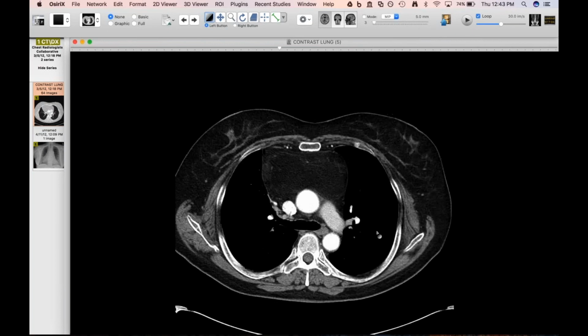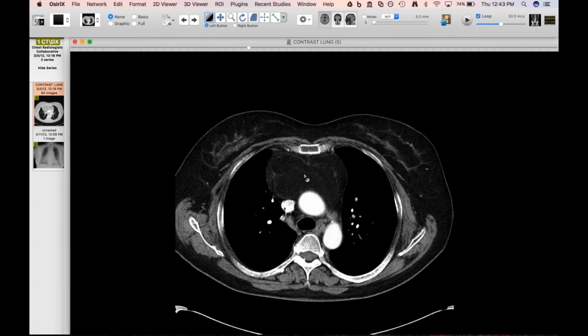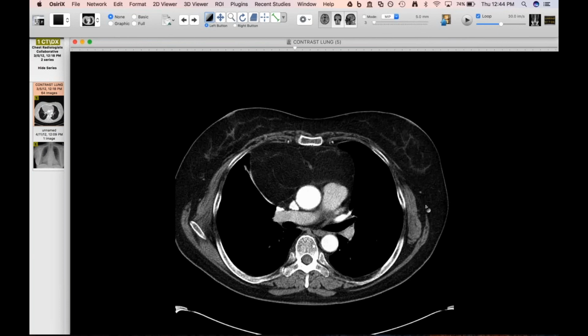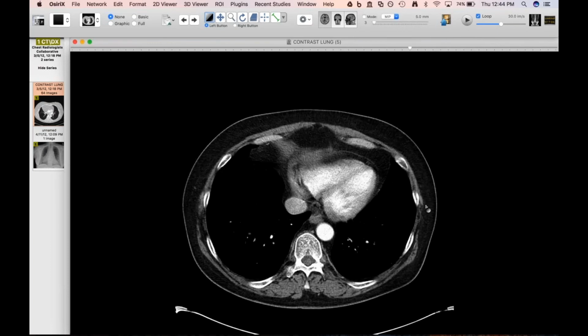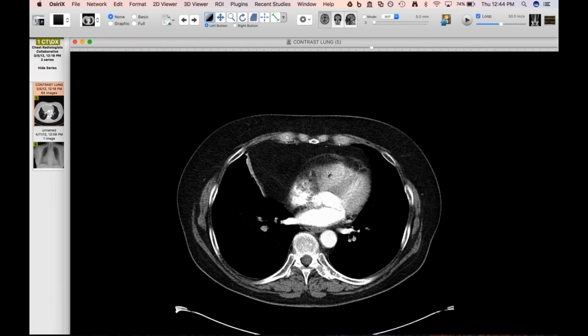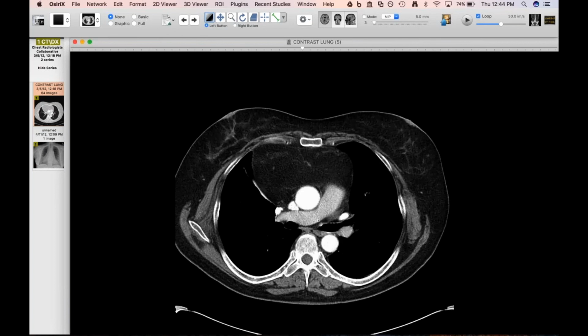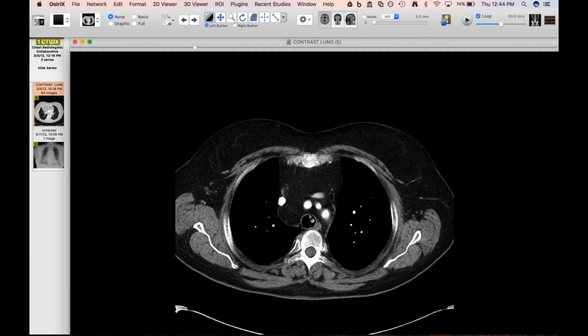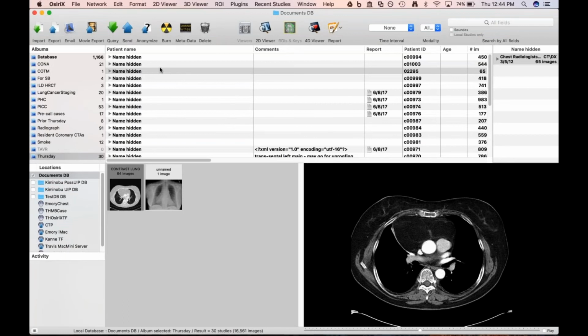I don't think so. I think we had this discussion in the past, probably prompted by this case, Jeff, if you remember. Yeah, the thymolipomas are described as these huge masses that just kind of flop over things. They don't really insinuate themselves anywhere. Yeah, I agree. I wonder if it's just a big mediastinal lipoma with some residual thymus hanging around. Yeah, as David said, mine was a liposarc just like this was. Other than the fact that I haven't seen a thymolipoma before, mine was involving multiple compartments like this was, and that was the reason that I would guess that.